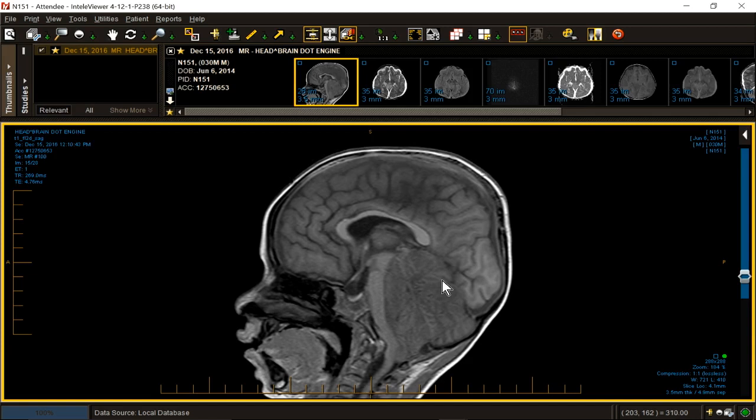It shows some of the folia that we attempted to illustrate in the Purkinjeoma or Lhermitte-Duclos syndrome abnormality, and the corduroy type appearance that one sees in proliferation of Purkinje cells in the cerebellum. But unlike our last case, which had mild mass effect, the mass effect is dramatic. And I hope you're looking at all of the other sequences while I am giving you some pointers and dialogue.